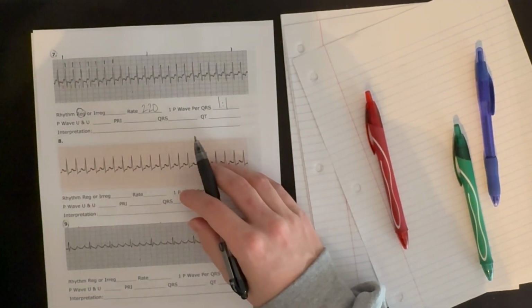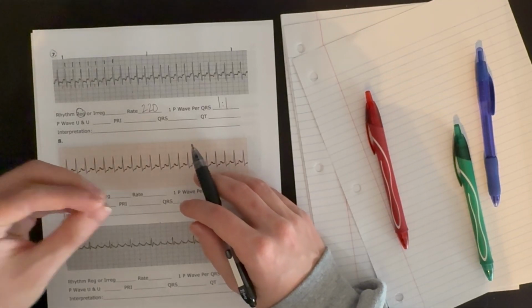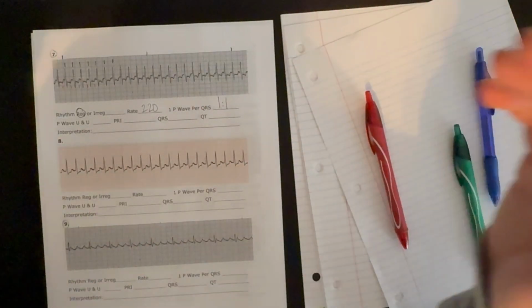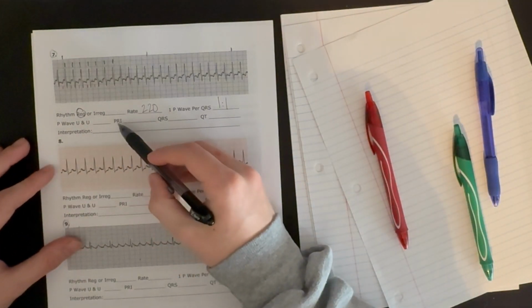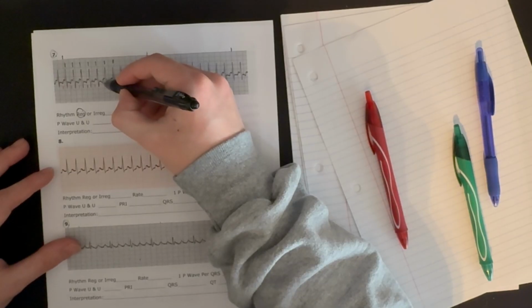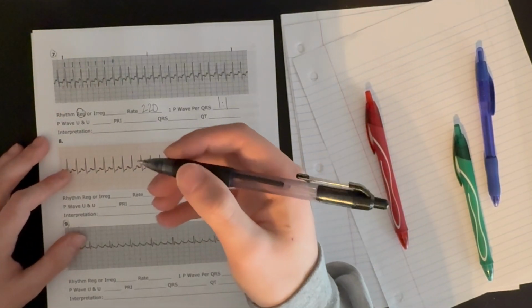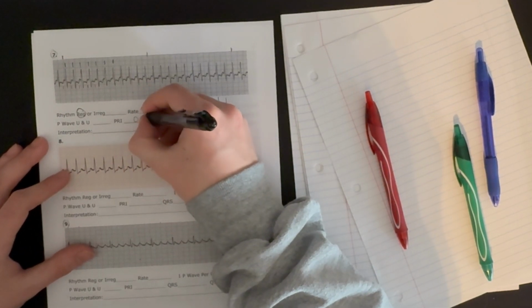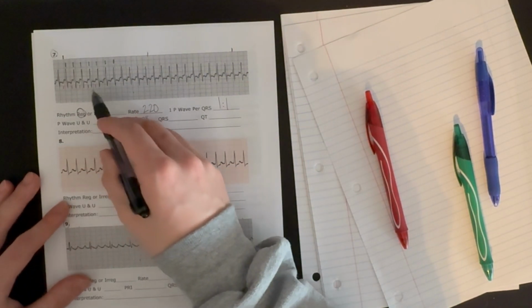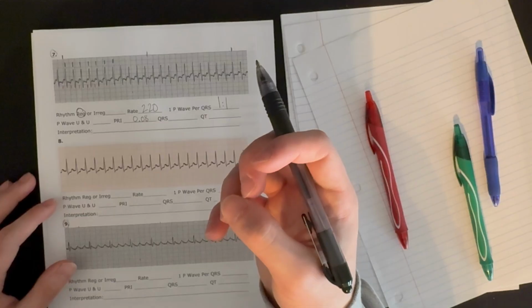That means our signal is originating somewhere above the ventricles in the atria, causing them to depolarize, getting to the AV node, through the AV node, and into the bundle branches and through the ventricles, causing them to depolarize each time. Okay, PR interval. This one's kind of hard to measure, but you'll see it's about 1, 2, 1, 2, 1, 2. It's about 2 small boxes, or 0.08 seconds long. So it's short, but the question is, is it consistently short? You look and count each one, and you'll find that it is consistently 0.08 seconds.